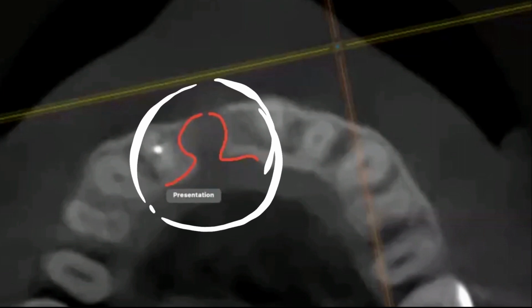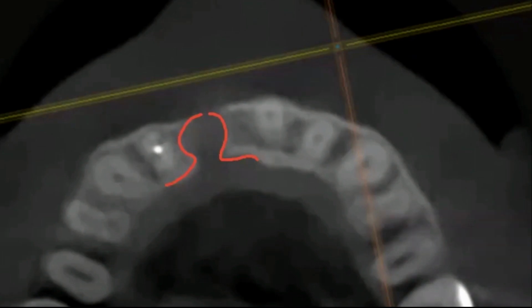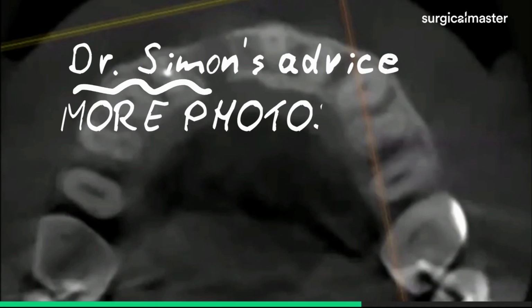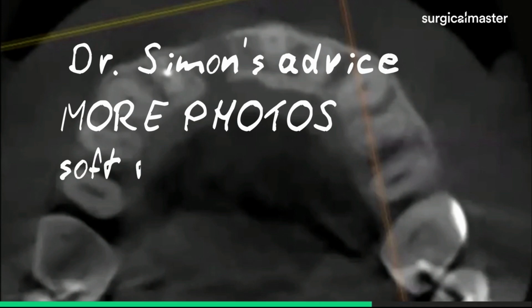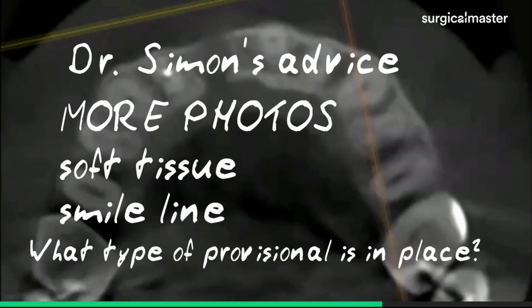And I would love to see more axial cross section so I can identify the nasopalatine and see if maybe that's part of the nasopalatine canal. It's hard to tell. So here's my advice. Send us a few more photos. I'd like to see the soft tissue. I'd like to see the smile line. I'd like to know what type of provisional is in place.